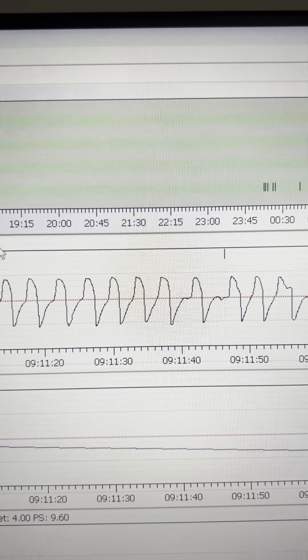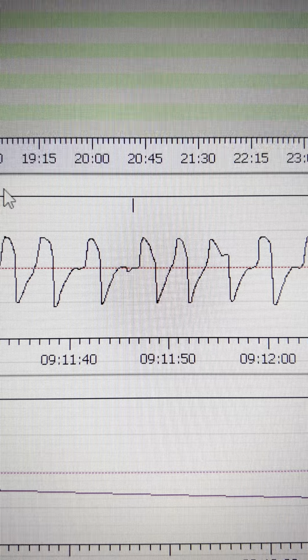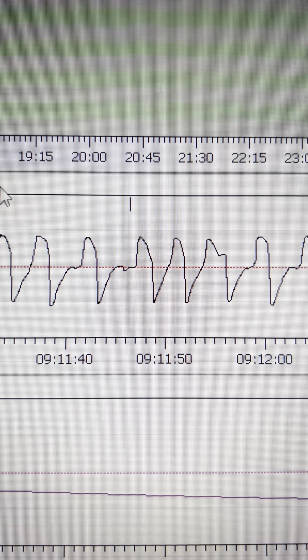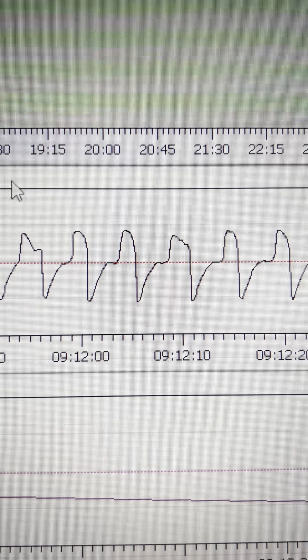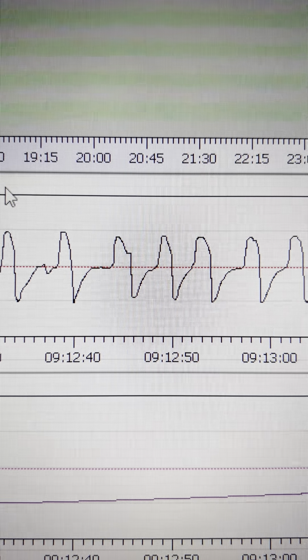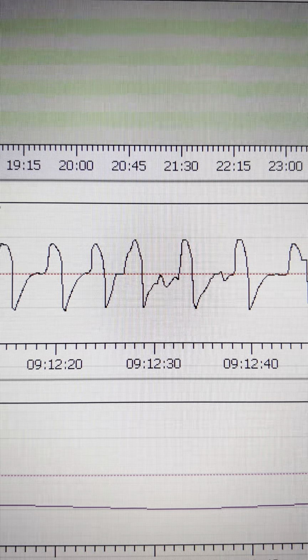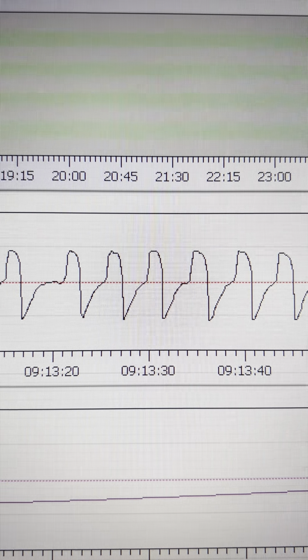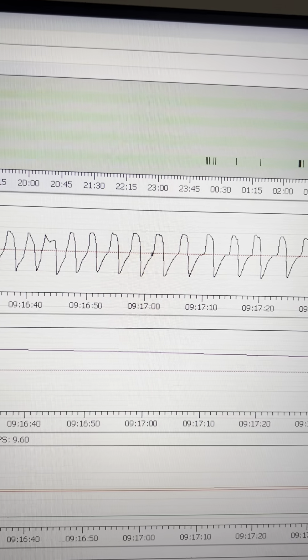Going further. Here you can also see a cutoff with the tiny breathing in, doesn't work. Slight exhale, and I'm probably just getting really tired here. You can see I'm not even trying that much anymore. Here too. Here I can't fully inhale without the machine helping me, and so forth.